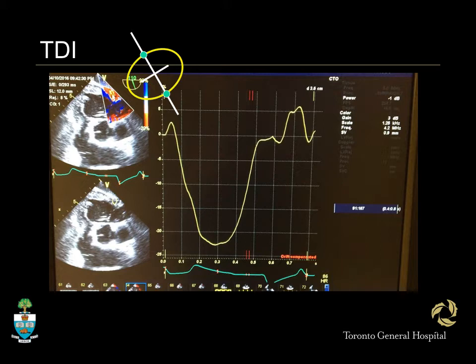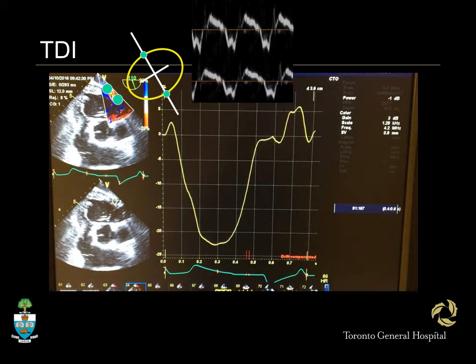And you have something like this that has two dots. The system measures the velocity of movement of one dot and the next dot. It looks at the difference in velocities, and from that it can tell whether these dots are coming closer together and how much.